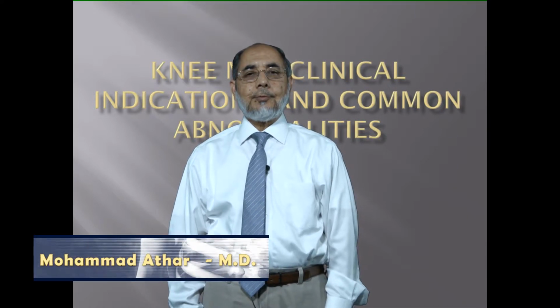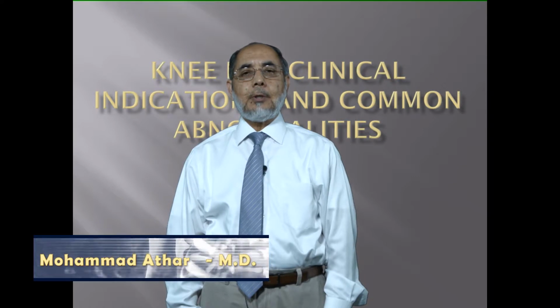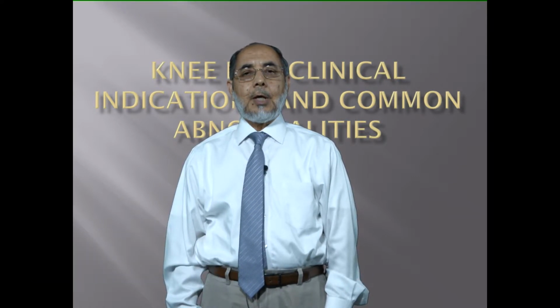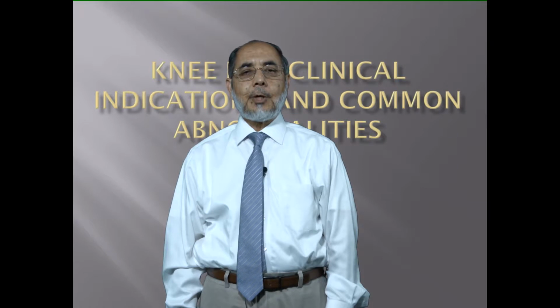The purpose of today's presentation is to make yourself familiar with knee MRI examination, and I will show you some common abnormalities that we encounter on the knee MRI.